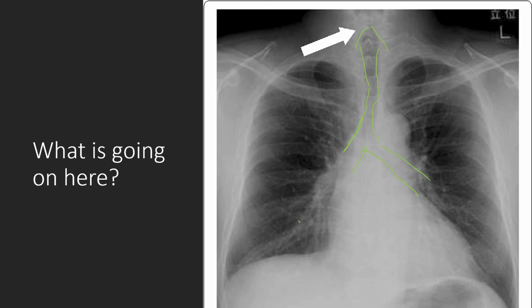You notice that this is showing a viral pattern in the lungs. Do you guys see this? Do you see all these viral pattern things? You see a little bit of ground glass opacities, right? You see all these little fine dots all over the place. Those are the ground glass opacities that go along with interstitial or inflammation that's going on.